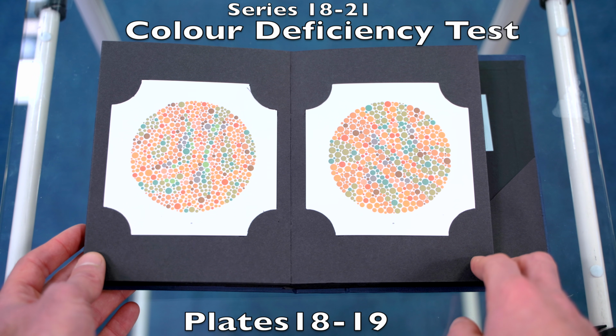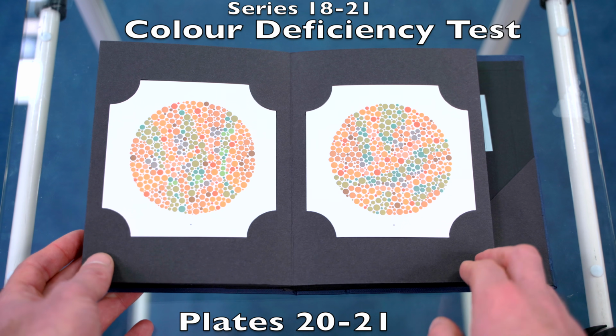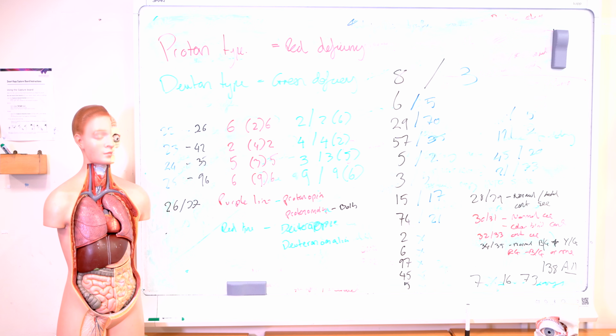(18) and 19, 20 and 21. And now we're going to flip the tables. For those of us with colour deficiencies, we should see something on plates 18, 19, 20 and 21, whereas those normal vision people wouldn't see anything.